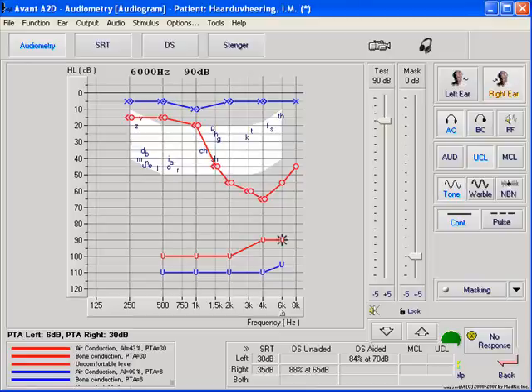Here we see an audiogram of two very different ears. The left ear has normal audibility for soft sounds, shown by the pure tone thresholds. This person also has normal tolerance for loud sound, demonstrated by very high level UCLs. This creates a normally wide dynamic range.